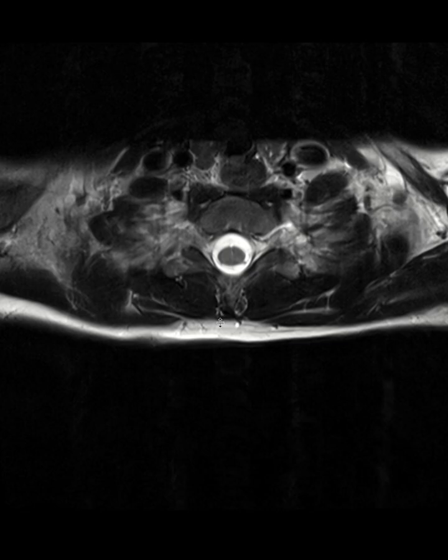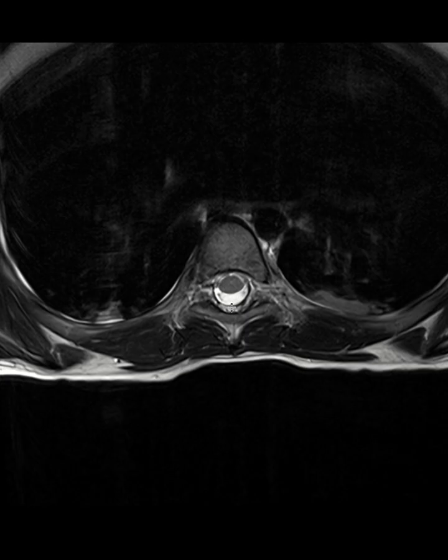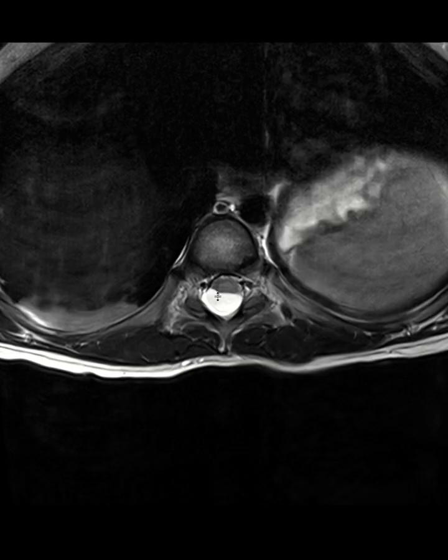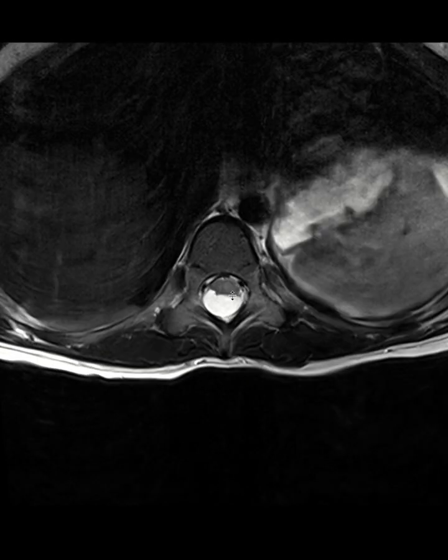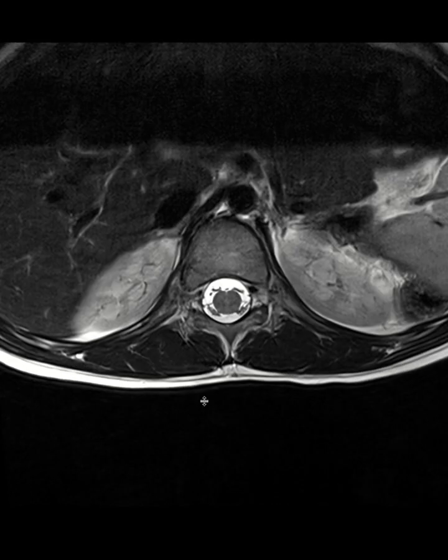So let's look at this spinal cord. When we scroll down, you see a very smooth, well-rounded appearance of the cord. This is the normal appearance. But when we come down to the level that I just showed you, you see that the posterior aspect of the cord is getting flattened. It means there is something here that exerts mass effect and is causing ventral displacement of the thoracic cord at this level, which was basically T8 to T10. And we already know that this was not enhancing.